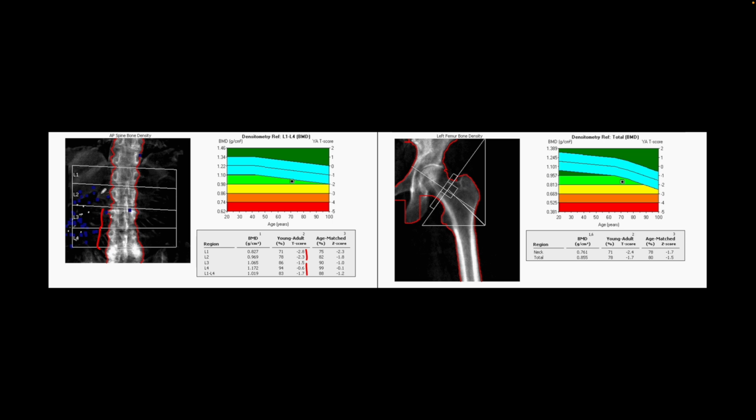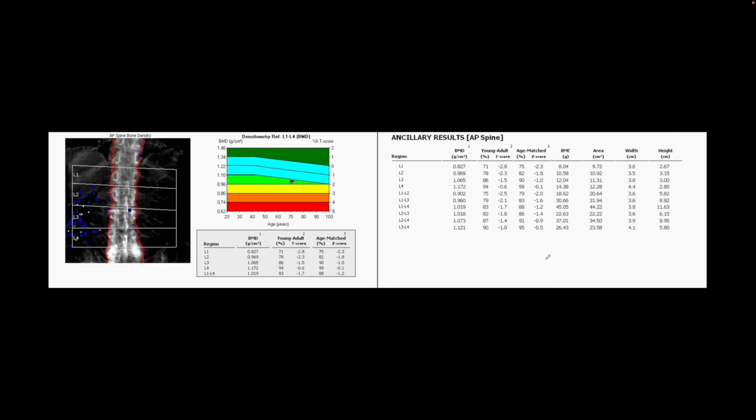So if I'm reading this, I will not include L3 and L4 because of degenerative sclerosis and significant difference in T-scores from other vertebral bodies. When we look at just L1 and L2, the T-score corresponds to what we see in the left hip neck region. All right, so here is another page from their analysis, and we find that if we include just L1 and L2 in our analysis, their T-score will be minus 2.5, and that would make them osteoporotic.